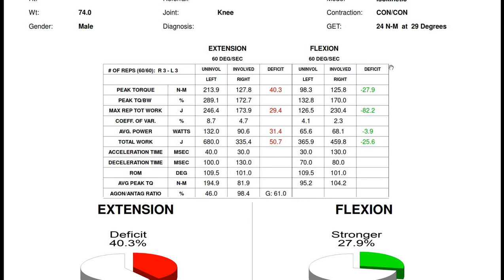So what would we make of this? Well, the reasons for the reduced knee extensor strength would be obvious. It's a simple case of, well, whatever the injury was, and I actually can't remember, it is still causing issues and it needs to be addressed.